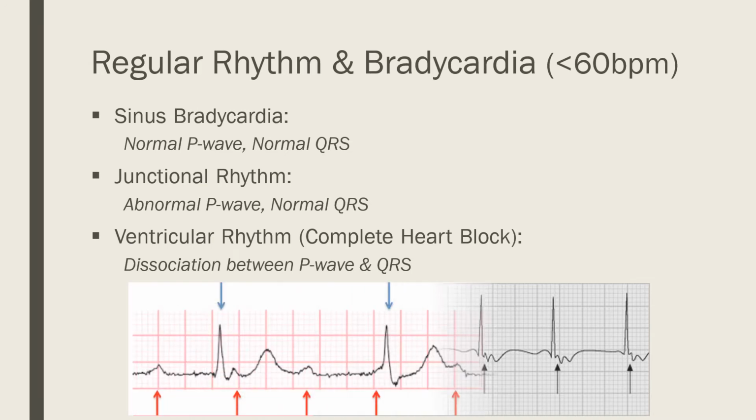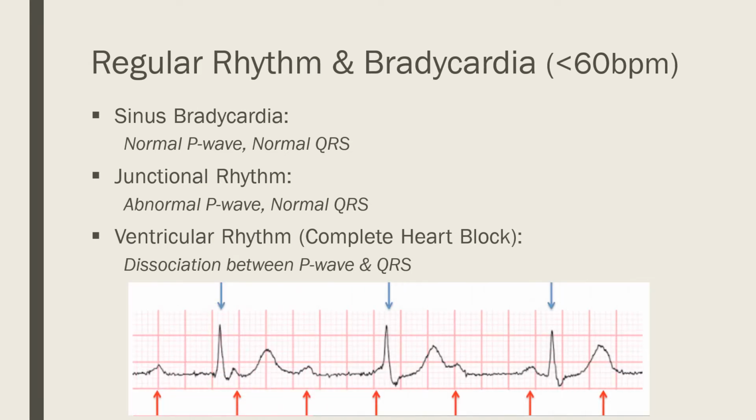Third, ventricular rhythm, in which there is complete heart block, so there is dissociation between the P wave and QRS complex as shown in this strip. There are P waves, but the P waves are not followed by a QRS complex, and the QRS are wide complexes because this is a ventricular rhythm.